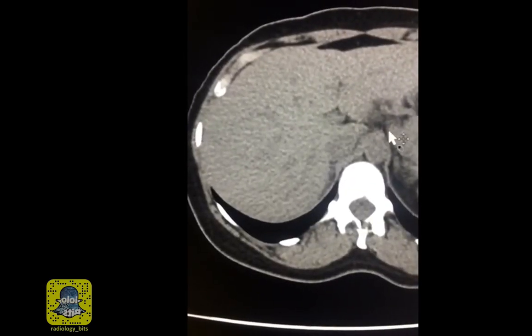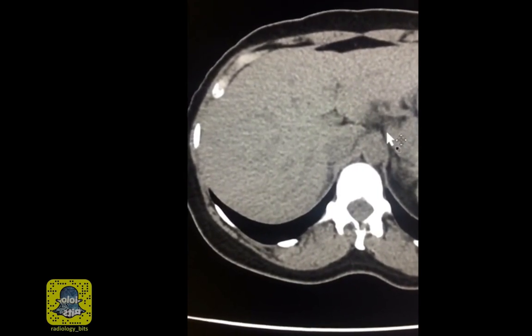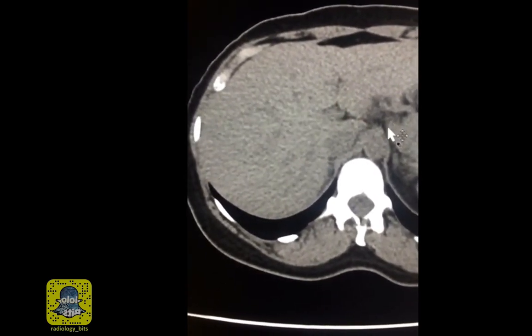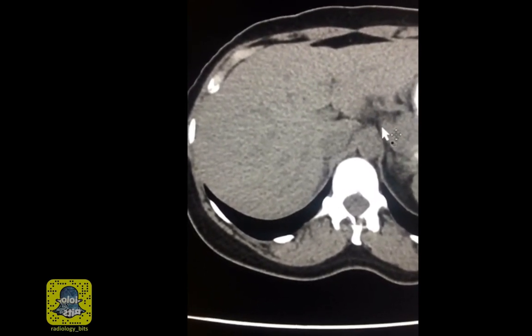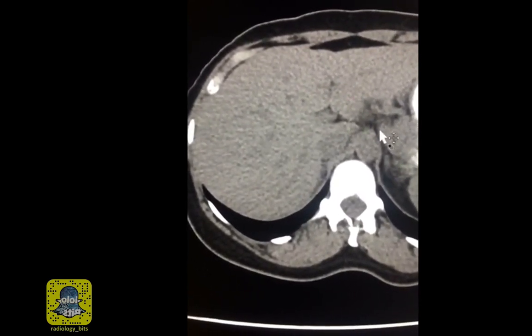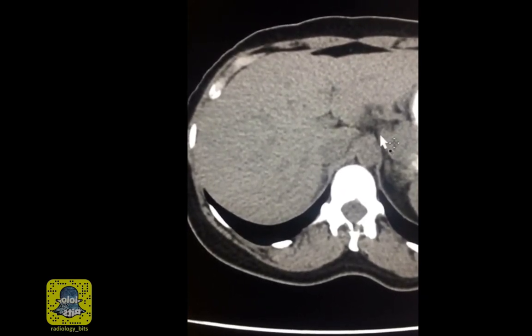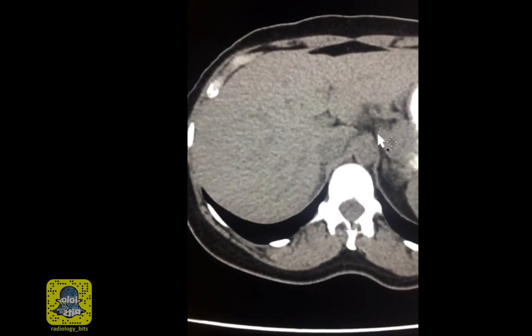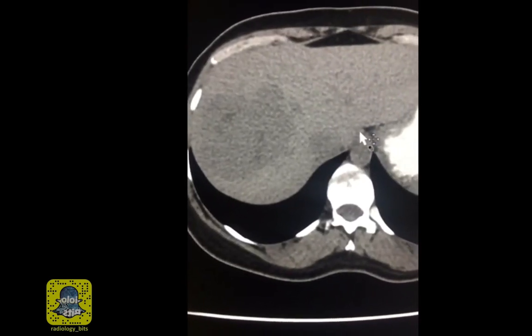The first staging point is a repeat of what we said before: change to a contrasty window. So let's do this together. I'll change from this window, which is the soft tissue window, to what we call a hepatic window. The soft tissue window has a width of 400 and a level of 40. We're going to change that to 150 and 100. And let's make the switch here.